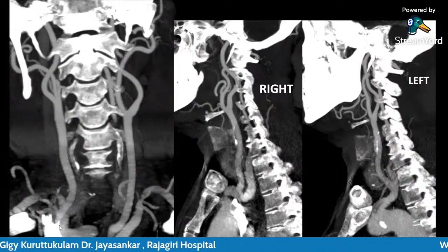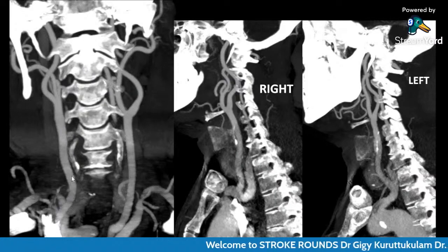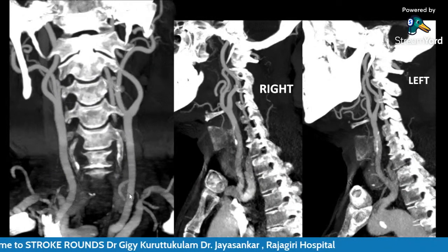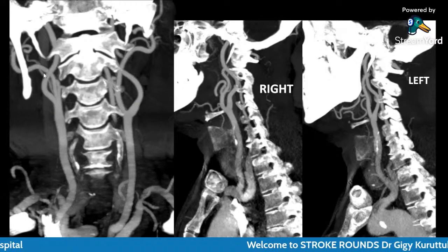Now, the patient was referred here, and the patient was initially taken for CT angiogram. The extracranial vessels were okay. These are the coronal images and the sagittal images showing the right and left carotids. So this is the AP view, the anteroposterior view. You can see both the common carotid, internal carotid, and external carotid.